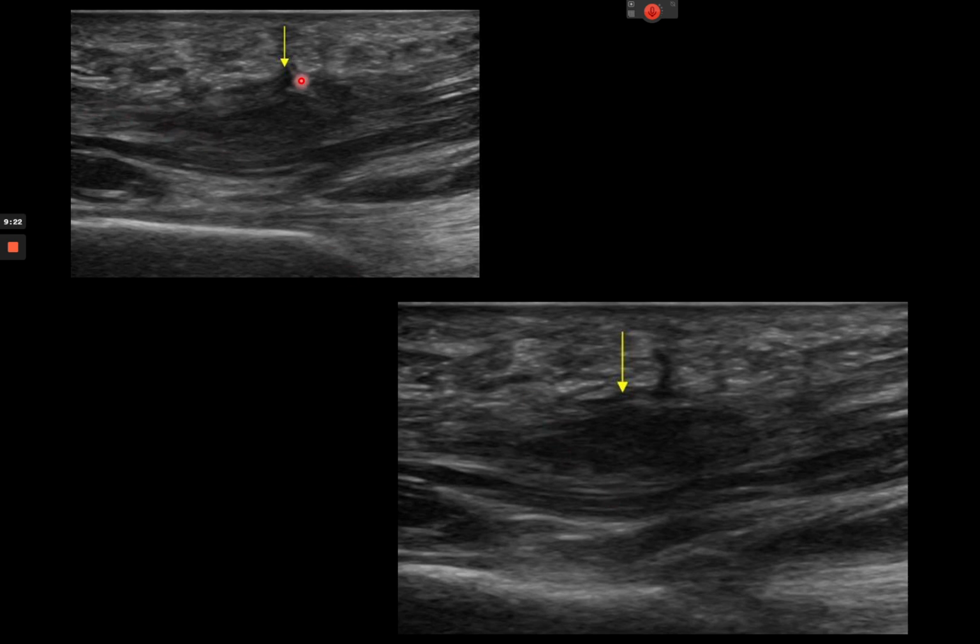This is often what a fibroma will look like, or even a partial where they've ruptured it. So these sort of injuries, this one looks more like a rupture. It's very disorganized. These happen sometimes in younger people where they might be a basketballer and they'll feel a pop underneath their foot. Sometimes they can get a bit of bruising there.